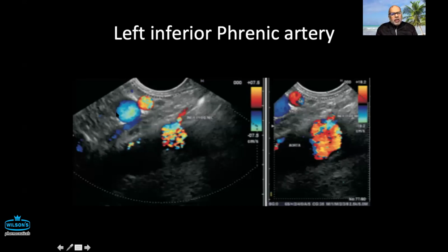What you see mainly is basically this splenic vein and the celiac artery, and then the celiac trunk, which actually gives the left gastric, which goes up, and then this goes forward and divides. So this is just before. Sometimes you can see it in the thorax, and then you see it across the diaphragm. Just for your information, if you see that in the mediastinum, don't get confused. So now I'm going to bring it all together.